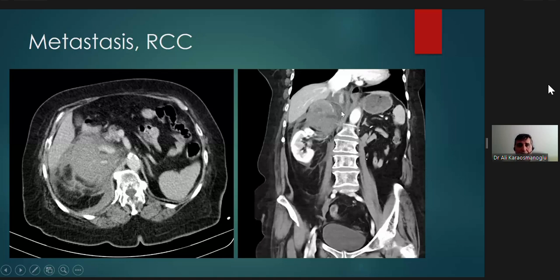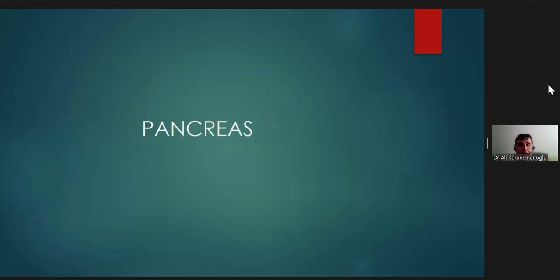On the arterial phase, you can again see. So you always have to look at the arterial phase images to see if there's any active contrast extravasation. These areas constitute active contrast extravasation because they are not present here. The urologist did emergency surgery, took out this hematoma, and cleared the area. Pathologic examination confirmed metastatic RCC, which spontaneously bled in the right adrenal gland.